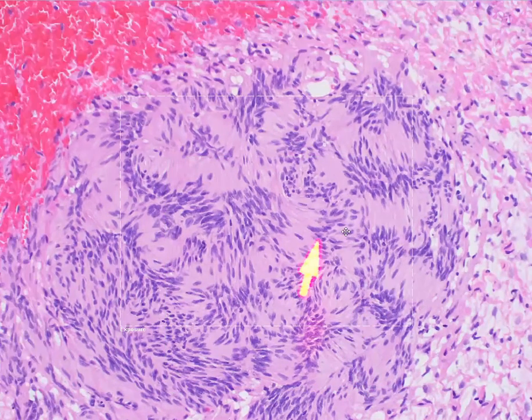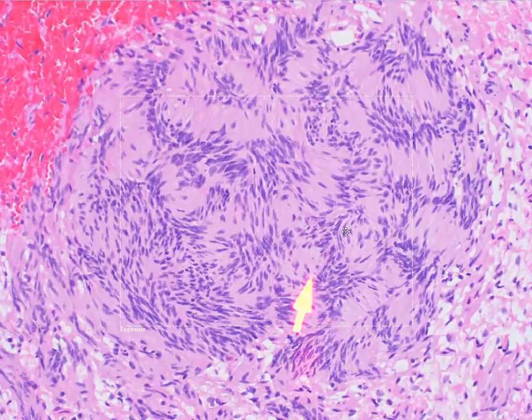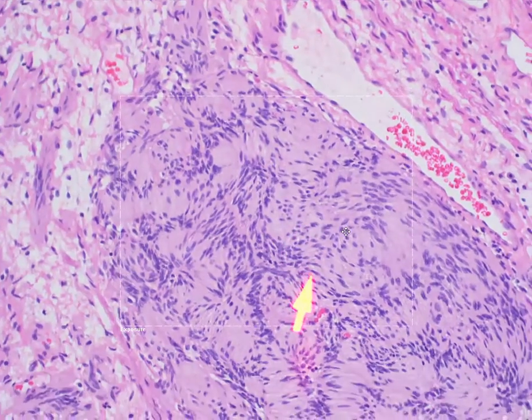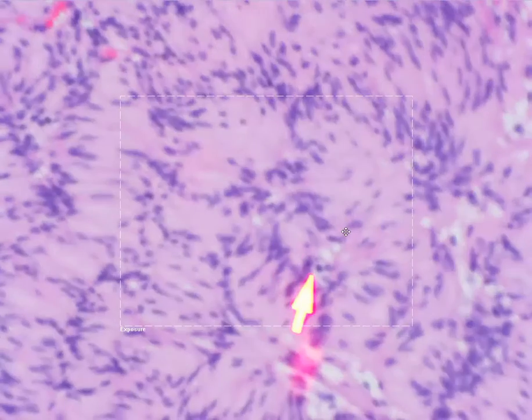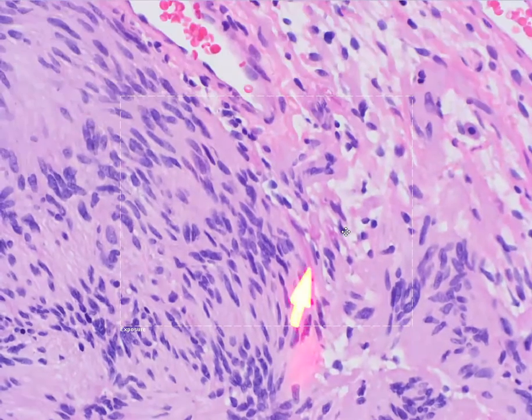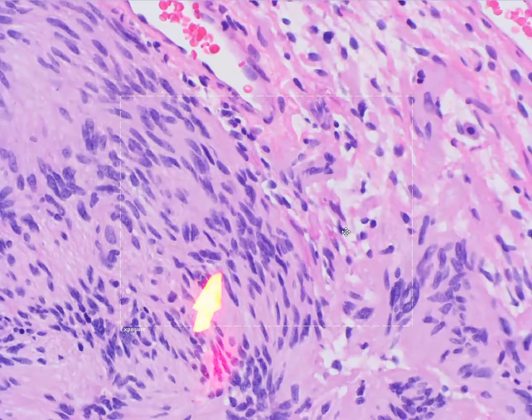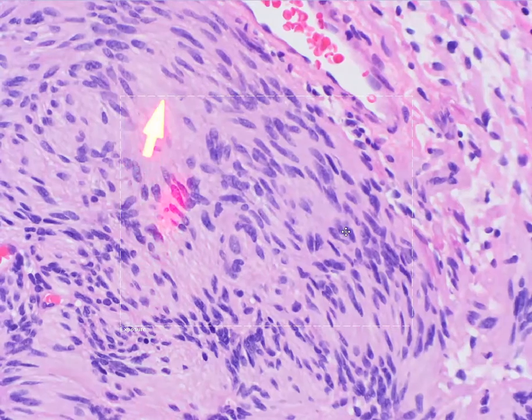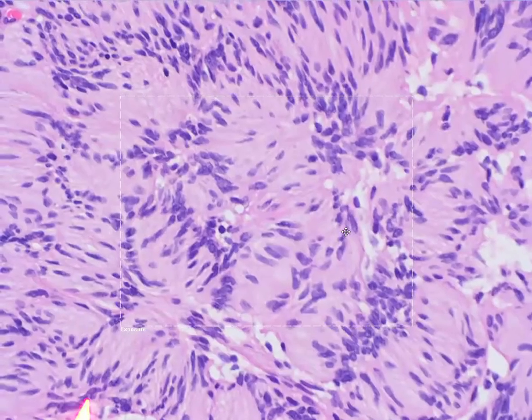Now there's a plexiform variant of a schwannoma that is usually comprised mostly of these Antoni type A areas, but when you look at a classic schwannoma, it'll have features of both Antoni type A and Antoni type B areas. So once again, those Antoni type A areas are composed of these cells with very ovoid nuclei, organized in a palisading pattern, so you'll have two rows of these ovoid nuclei and then a zone of pink collagenous areas. Has a very classic pattern.